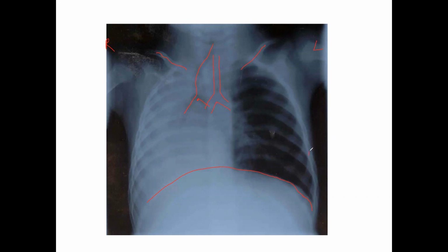So where your ribs meet the diaphragm, you've got an angle that gets created there, and it's called the costophrenic angle. You want that to be nice and sharp. If it happens to be dulled, blunted, or obliterated, or anything to that effect, atelectasis, consolidation, pleural effusions, things of those natures can cause that to not be nice and sharp.